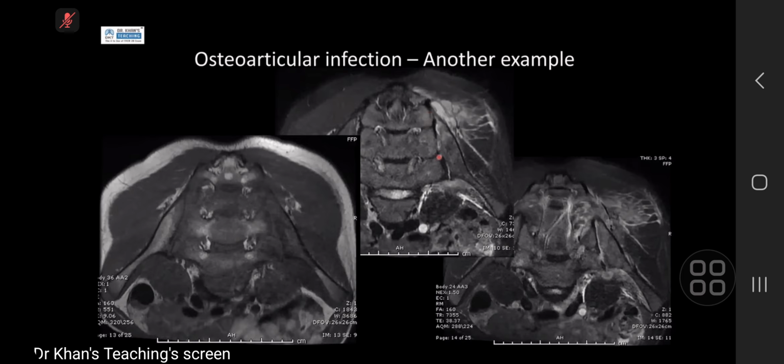It's nice and straight. And what you have here is quite a lot of fluid, a high signal within the joint, extending outward into the soft tissues. And then post-contrast, you see these nice little abscesses in the soft tissues, and this is capsular hypertrophy or protrusion, and that's one of the key features to know if there's an SI joint effusion, this capsular bump at the top part of the SI joint. Okay.